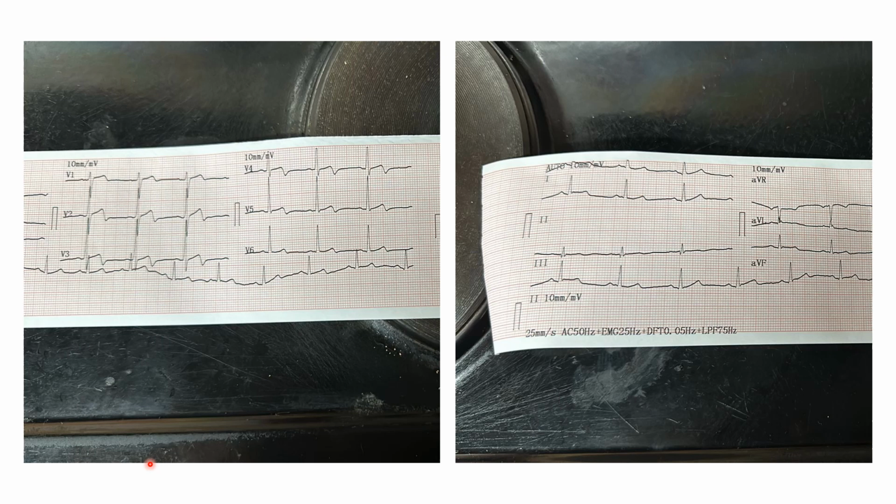He's only getting pain on exertion. You may start to think that it's an unstable angina or something along those lines. So I'm going to try my best to show you guys exactly what's going on. And if you have a chance, maybe pause this, go through the ECG that we've got here, and maybe try and decide for yourself what could be going on.